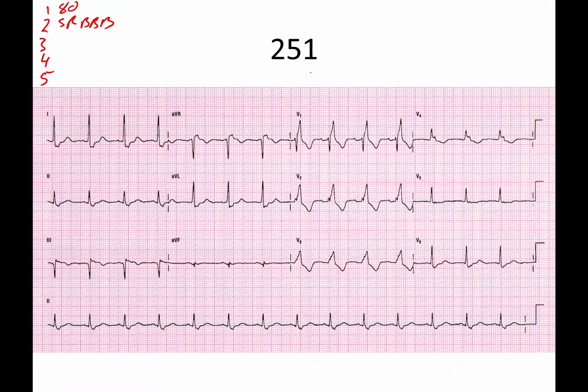And what's our mean QRS going to be? Change colors here. We're going to see that this one is positive and that this one is negative to positive. I'm just going to go ahead and say that one's probably our isoelectric as well, if you look at how tiny that is. And so we'll go ahead and call it positive. So we'll say we're up. That means we're in the normal quadrant, and our aVF is iso. And that being said, who's perpendicular to the aVF, if you look at your dial, that's going to be lead 1, and we're going to do lead 1 in the normal quadrant, which gives us a 0 degree mean QRS.